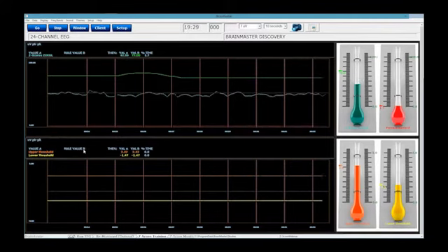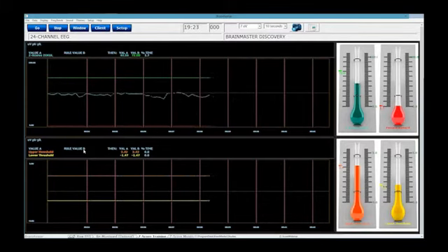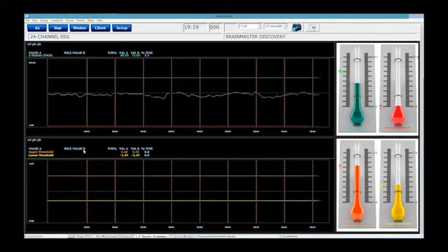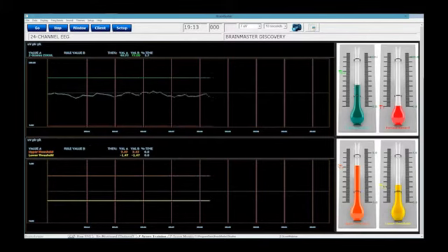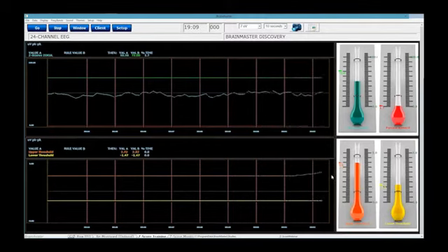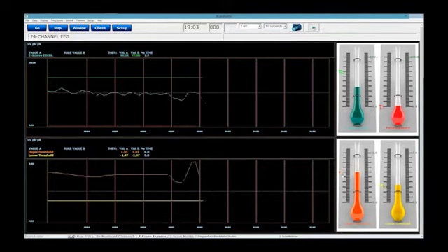You have an upper threshold and you have a lower threshold. That is the only difference between PZOK and PZOK UL. PZOK has one threshold, one upper and lower standard deviation that you can control. PZOK UL, on the other hand, has an upper threshold which can be controlled by the U key or the Shift U key, or, as I said before, the thermometer.